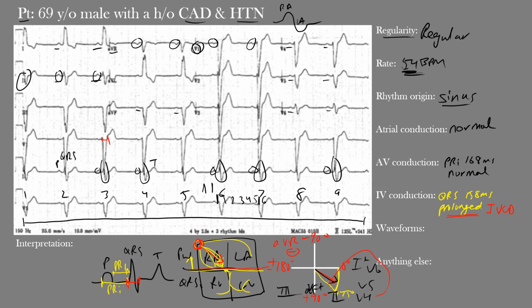The Q waves may appear abnormal in those inferior leads, that's 3 and aVF, although there's actually a small R wave present in lead aVF. Therefore, the Q waves here are not abnormal, but likely the result of conduction delay, and we'll discuss that shortly. So here are our inferior leads, 2, 3, aVF. We don't see Q waves here, but an R wave, okay? So no Q wave. This would be an S wave, right? Remember, the Q wave is the first negative deflection after the P wave.